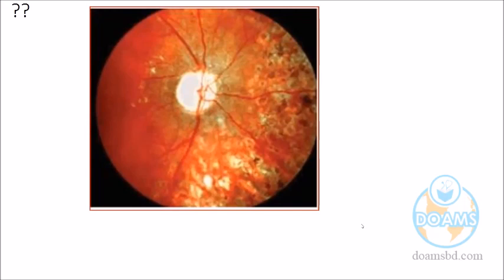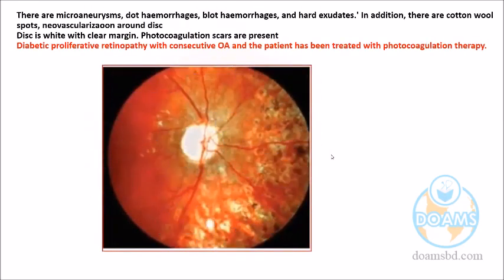In retinitis pigmentosa we can find a spiculed retina, a spicule appearance of the periphery of the retina. Yes, sir. Okay. But there are some black spots, right? This is the application of the laser; these are the spots. I'm telling by my own words, not from the book. Spot areas, right? So it is laser photocoagulation commonly done in the diabetic retina.